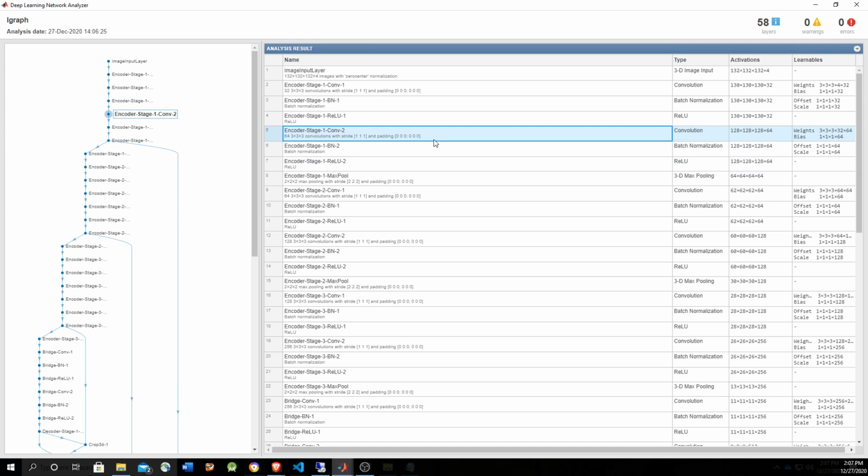And the convolution is good. As mentioned before, it's a neighbor processing operation, which is good to capture local patterns, while the max pooling is going to be able to capture patterns within patterns, between patterns. So it's basically taking the maximum in a stride zone, and it's going to be able to capture these global properties eventually. Every time that you execute a max pooling, it's going to divide the size of the image by 2.